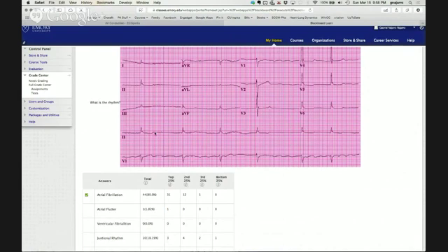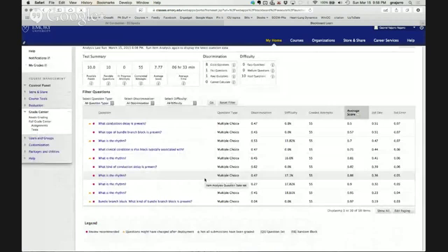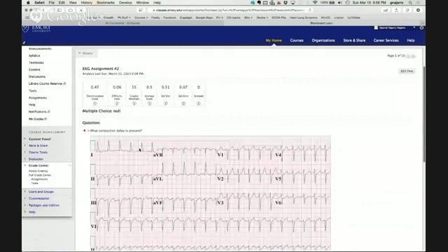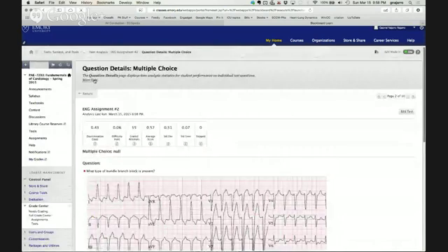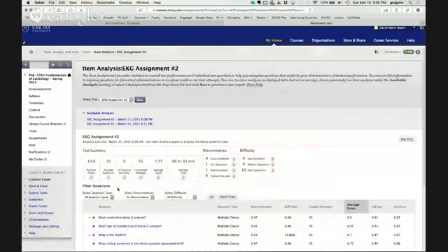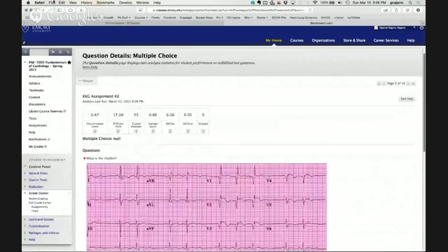Okay, so those are some of the questions. I know I had a question. I don't remember which one it was, but where the QRS was all jagged. I just couldn't understand what was going on there. All right. Well, there's only 10, so let's quickly go through this one. No. This one? No. Oh, sorry. I think it might have been the ventricular tachycardia one. Yeah, I think it was.